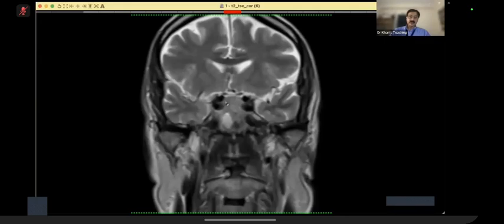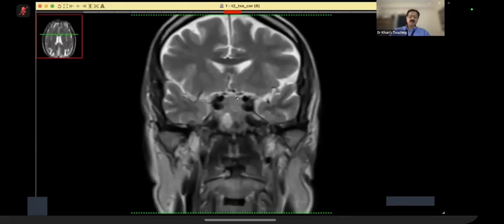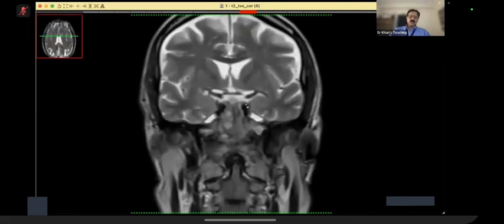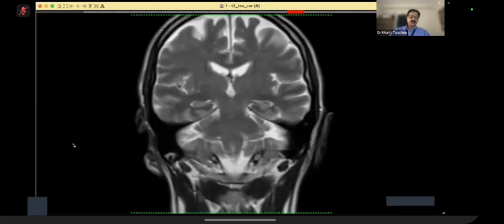Please remember, this kind of VIVA happens in the exam. There are examples where the whole of the VIVA is on a T2 weighted sequence. And the things which I'm telling you, exactly that can happen with you. What is what? The fine touch of it. We were talking about the optic chiasma. And of course, this is the MCA, and this is the MCA. So even here, you can do the fine touch of it, where the tumor is going.